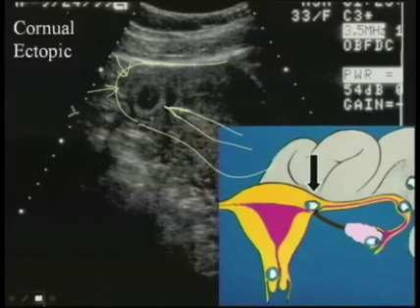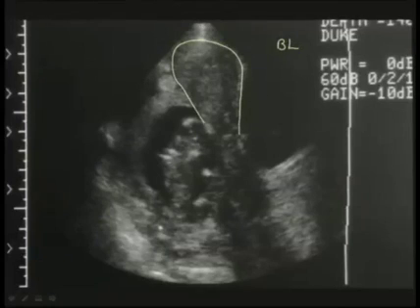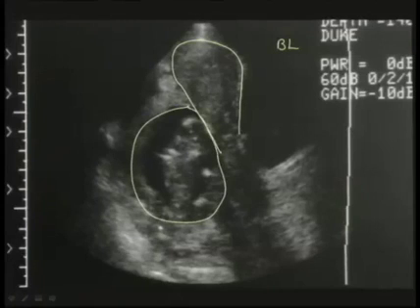So here's an example of why that happens. The endometrium comes right onto the gestational sac, ending in a blunt T junction. Here's an example of an ectopic pregnancy that is so abnormal that it's actually quite easy to mistake. This is a transabdominal scan through the urinary bladder here. This is the uterus outlined here, and the gestational sac is clearly extrauterine, and in fact is outside the GU tract altogether. This is an abdominal pregnancy.